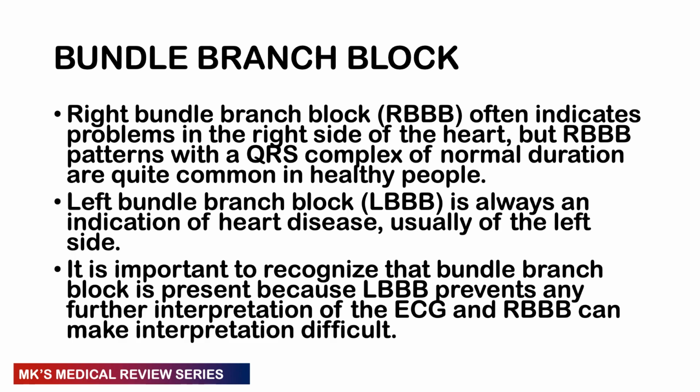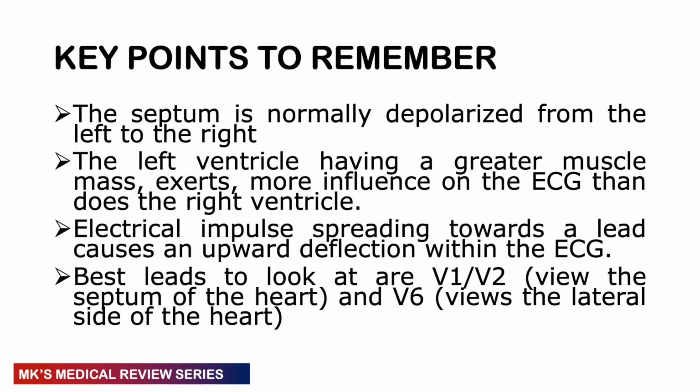Remember, it's very important to pick up these pathologies. Like I told you, left bundle branch block will prevent you from interpreting your ECG even further. Right bundle branch block will make your interpretation quite difficult to do. So what are the key things to remember before we dive into how to determine this? Number one is remember that the septum is going to depolarize from the left side going to the right side.